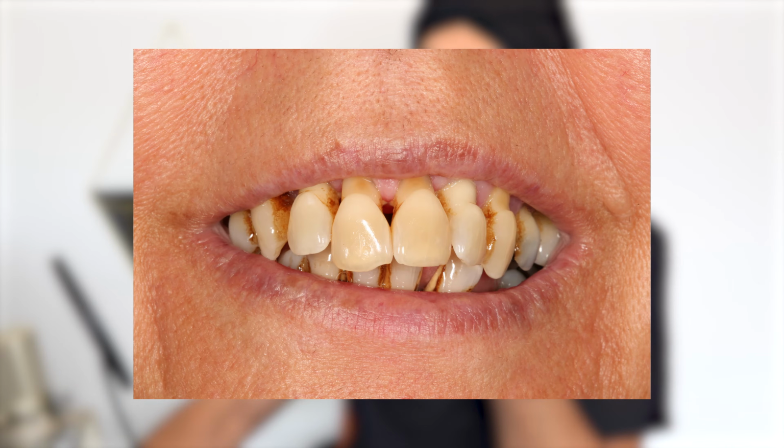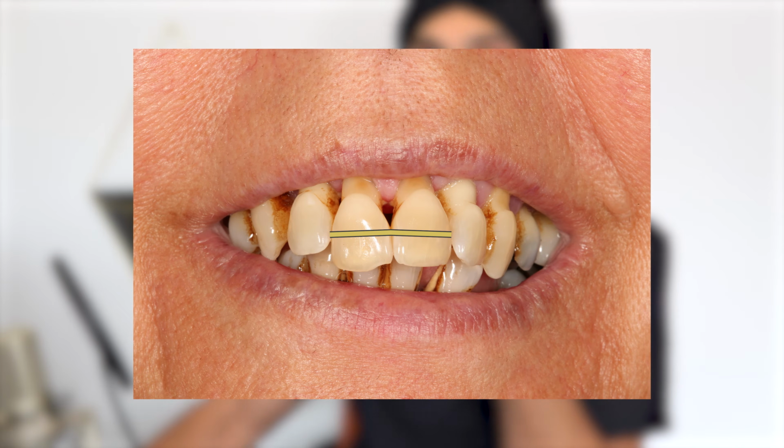Here you can imagine that the bottom teeth are finishing somewhere here. So this is the amount of overlap we have between the front teeth. Now, if we have a lot of overlap, that's absolutely fine. A lot of people do, but we tend to get more complications because of the biting forces and teeth chipping off and things like that. So we want to reduce that overlap. Typically, once we know where the top teeth are supposed to be, we then just shorten the lower teeth so that we've got maybe 1 millimeter or 2 millimeters of overlap there.